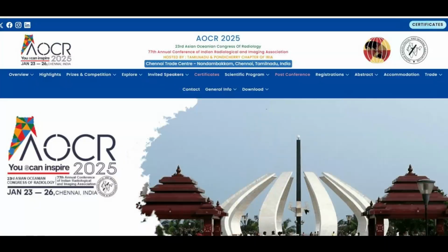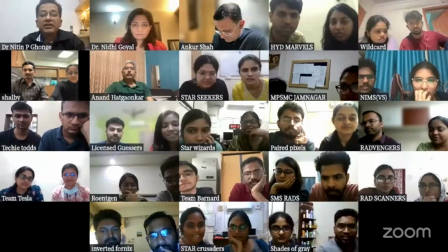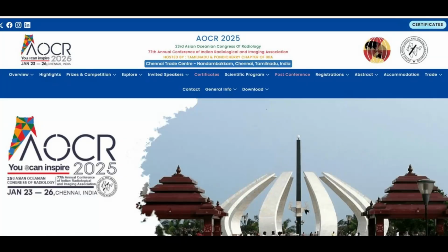Hello everyone. This 50 radiology quizzes in 15 minutes is through the online quizzes which had been conducted by the quiz masters before AOCR 2025 Chennai, which had been held on 23rd to 26th of Jan. You can see a glimpse of the organizers of AOCR at the end of this session.